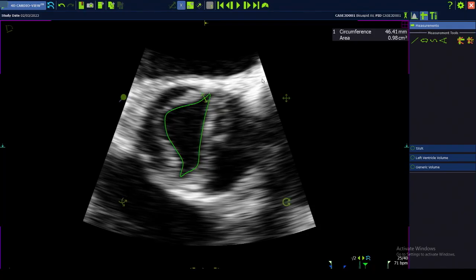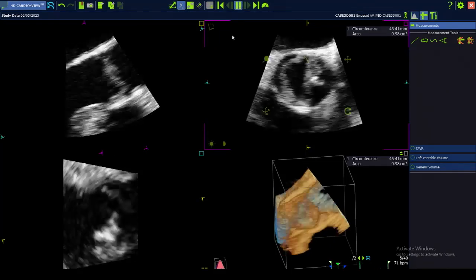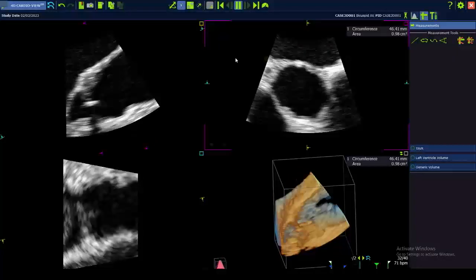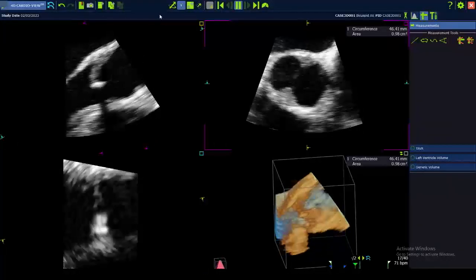Okay, great. So the other option you could do with this, I'm just going to get out of this big image by just hitting this box in the right-hand corner again. There's these 4 squares. That gets me back to where I was in my big image. I'm going to go back to play this again. So we did this using MPRs. If you wanted to look at the valve sort of like the 2-click crop that she was doing in the echo pack, you can do that here also.